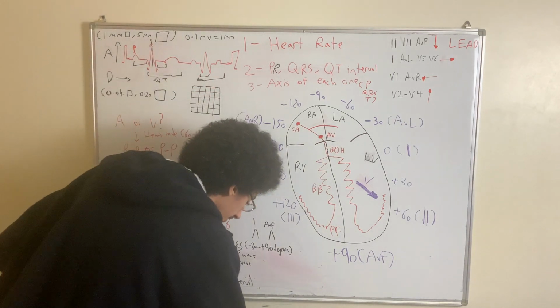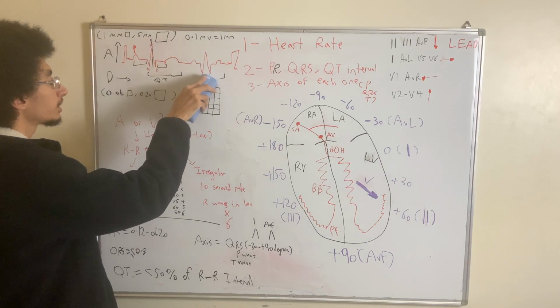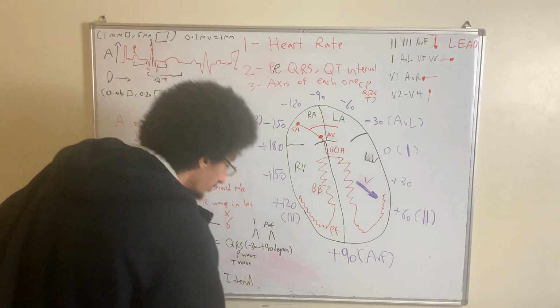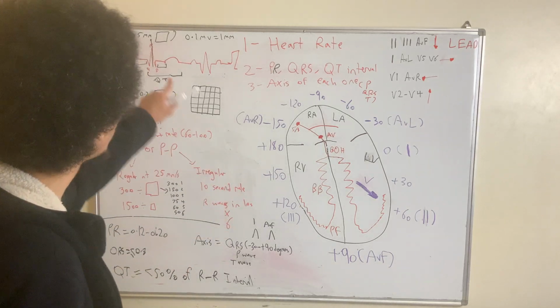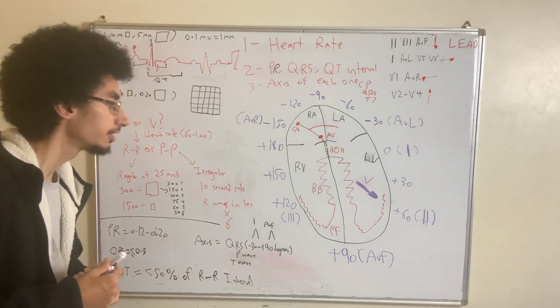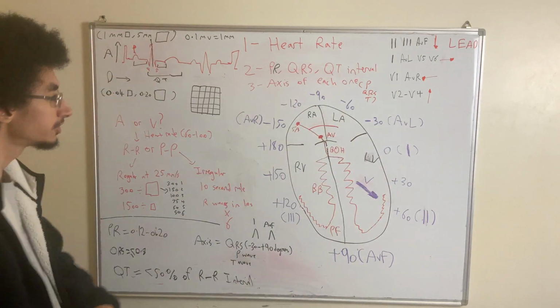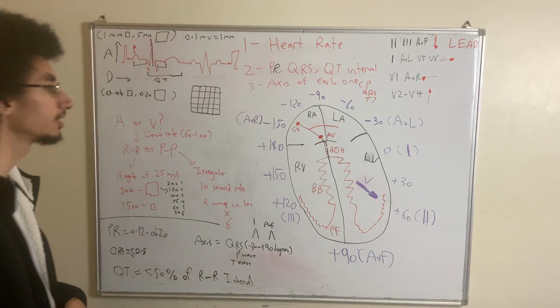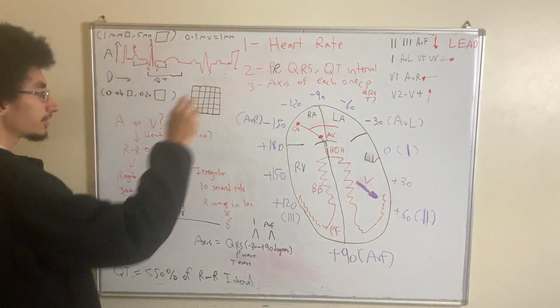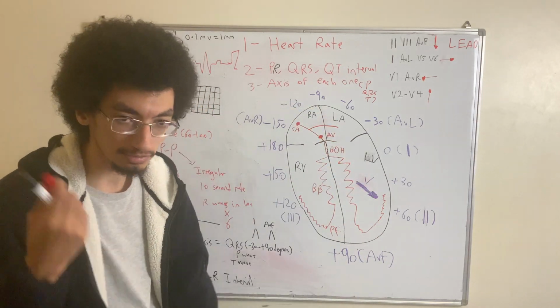So, axis, very simply, there's a very simple rule, and we'll come to the cardiac axis. To know whether the axis of the P wave, the QRS and the T wave are normal or not, revise one more time about the cardiac axis. Remember the cardiac axis, with all these leads placed together, recording this vector going inferolaterally towards the left, right?